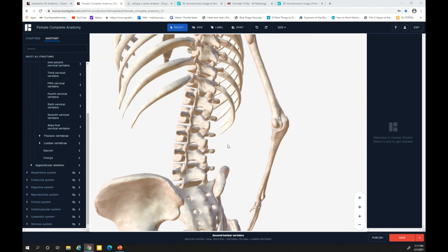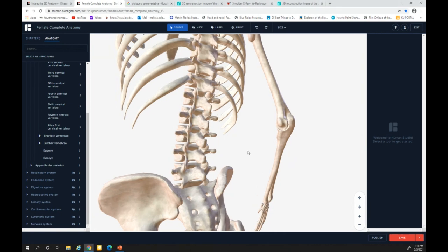All right, so I'm going to rotate this around so that the patient's face is facing the bucky, and we'll be looking straight at their back. Then I'm going to rotate the patient back into that RAO position, and I want you to watch the movement of those structures as they turn with the patient, and try to watch those structures come into view.